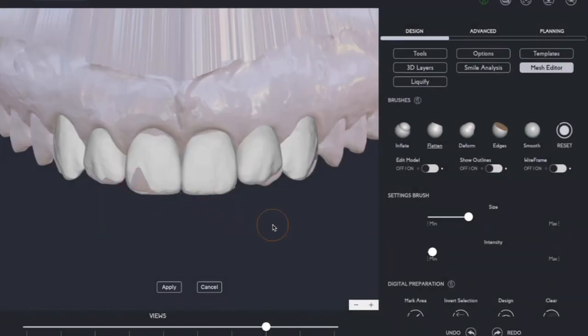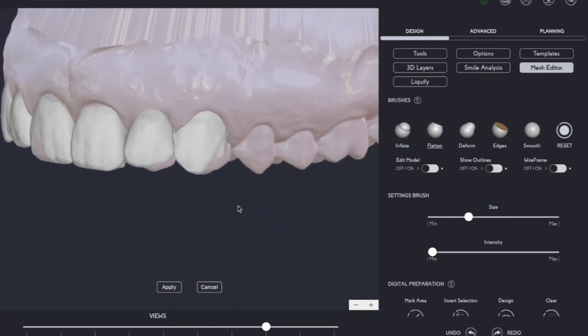All right. What is great about the Mesh Editor is that you can make small adjustments onto the design. For example, here I can bring the size of my target to a bigger size. Let me just do it again. Click here in Brushes. Click on the tooth. Notice that the tooth is dark gray, so that one is the tooth that I'm going to be adjusting, and I can move the whole thing all together.